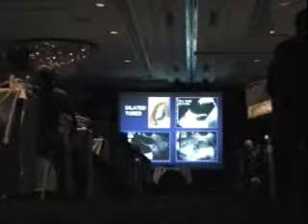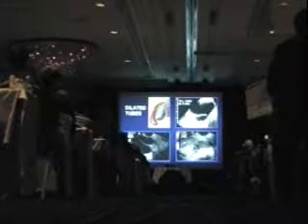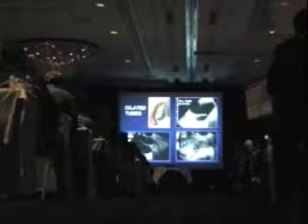As the tube becomes filled with complex material, it becomes much harder to see the ovary. And when would I see the tube filled with complex material? Well, with something like PID or with blood in the tube. So I'd like to know a little more about the history, please, to help me decide which of those two it would be, because clinically, pus and blood act quite differently from a clinical point of view.